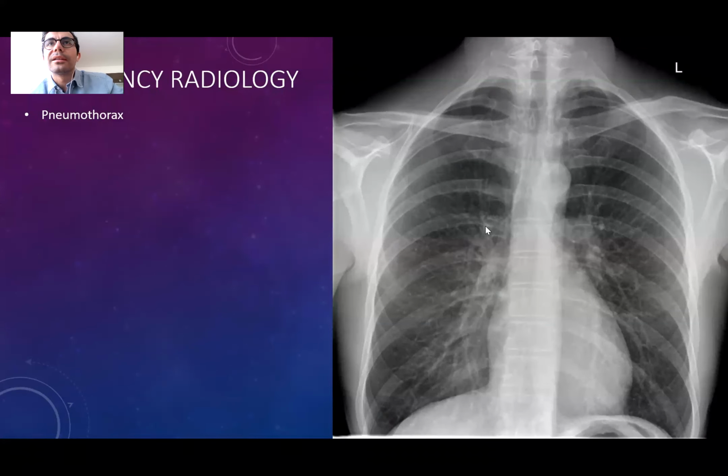So it's pretty hard to see here, but I think it's on the right side. Yeah, I used to be seeing it, but okay, I will not ask you anything that I cannot see. I'll make sure of that, don't worry. Let's pass this one.